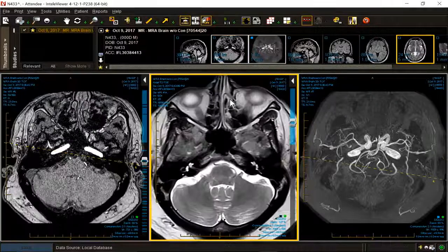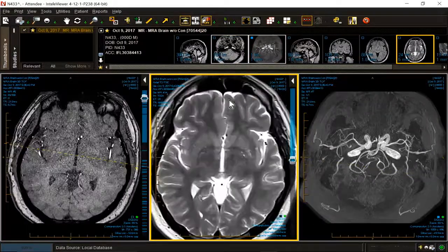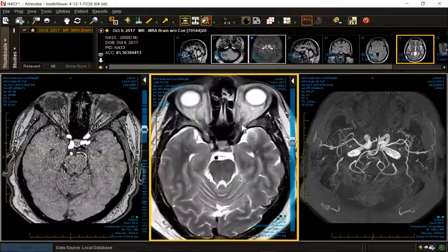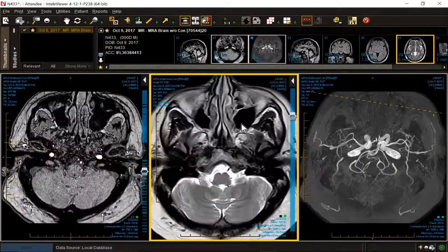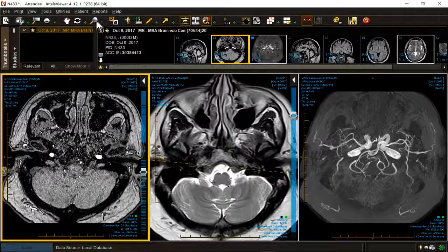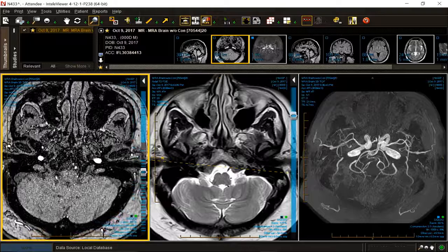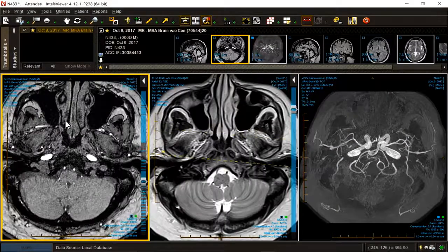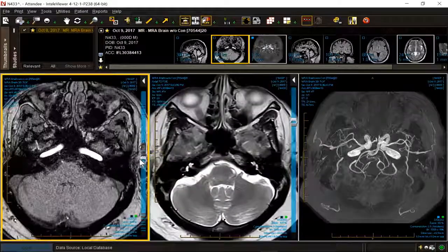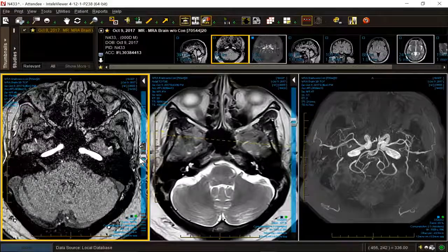Yes, there is a little bit of sinus disease for those of you that are a bit OCD. But all radiologists are a bit OCD, otherwise we wouldn't be radiologists. But it's not good to be an overcaller. You're better off being right smack in the middle or a slight undercaller. You miss a meniscus tear, you've done the patient a favor. It's true.